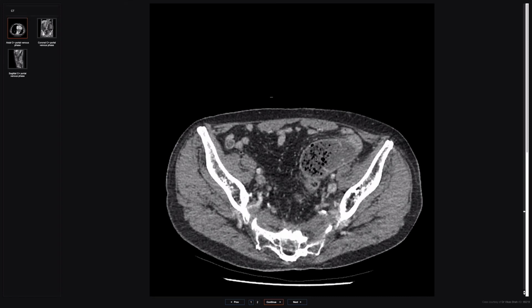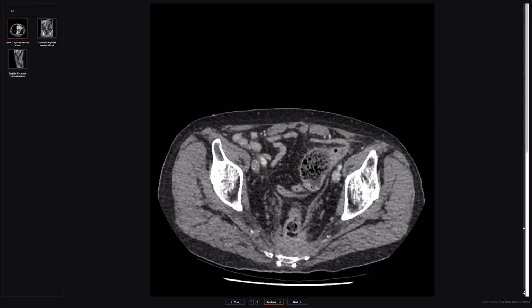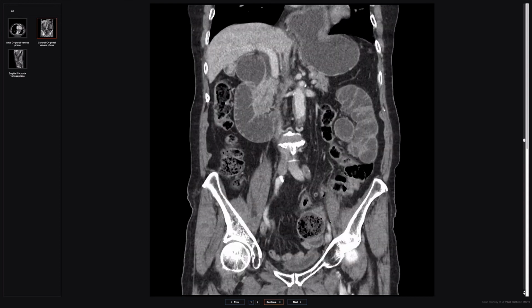So this is known as the small bowel feces sign, because this matter is said to look like the feces that you normally see in the large bowel. And this is a sign of stasis, and it's a sign that the transition point is somewhere near here. And you should always analyze these on multiple different views. So always make use of your coronal and sagittal reformats.